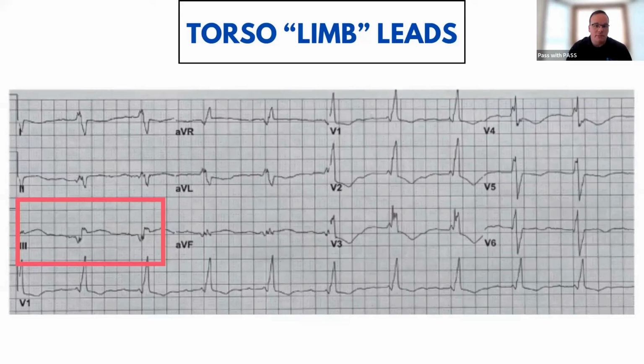So it doesn't make a tremendous difference in this patient specifically. It's not like we're seeing no STEMI pattern to a STEMI pattern, or ST elevation all over to no ST elevation all over, but it does certainly make a difference. I have lead 3 highlighted here, but also pay attention to what leads 1 and, I believe, 2 look like in this image compared to the next image I'm going to show you, where the limb leads are actually placed on the limbs.